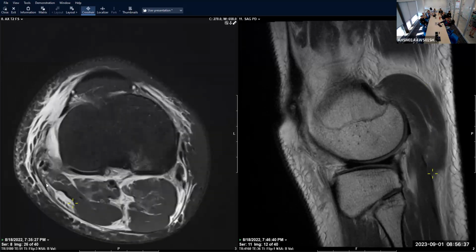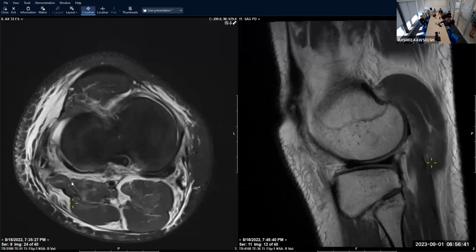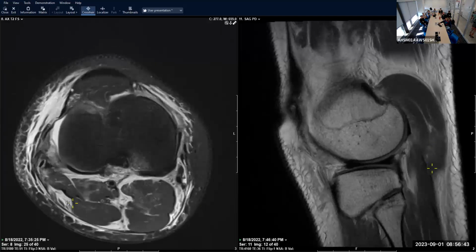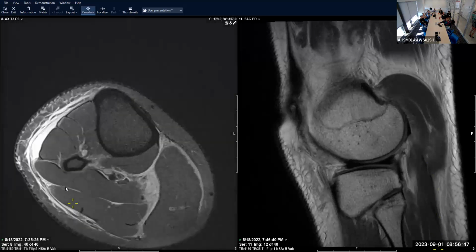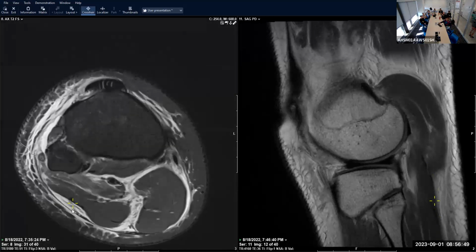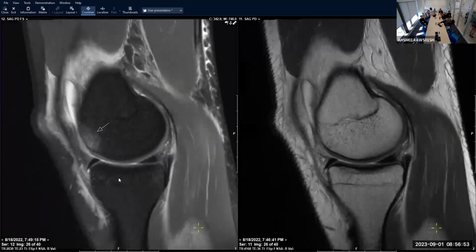And so, posterolateral corner injuries, a lot of times the capsule gets disrupted, you see this marked soft tissue edema at the posterolateral aspect of the knee and the gastroc and soleus muscles. So if you start seeing stuff here in the soft tissue, start trying to look for any posterolateral corner injury, I would say.